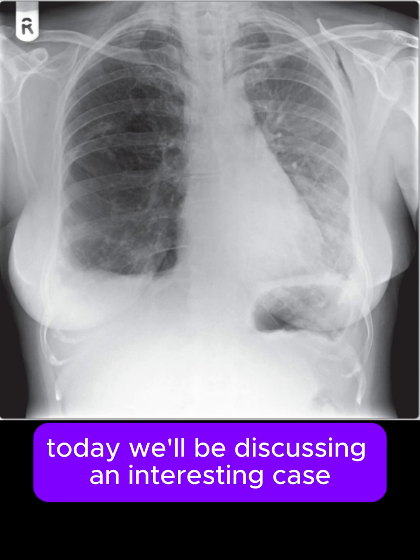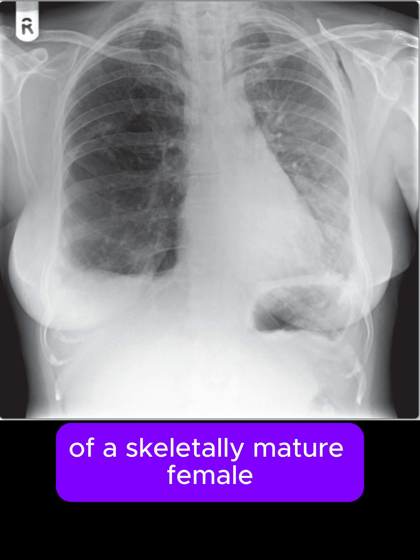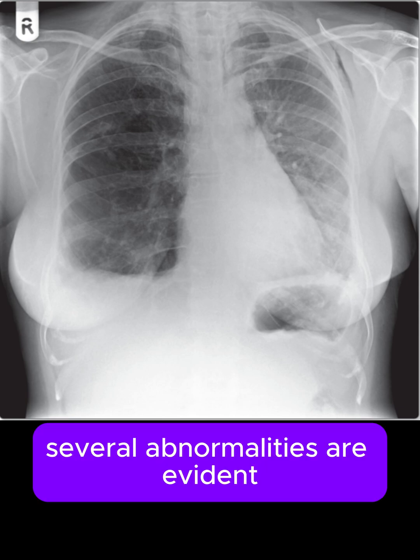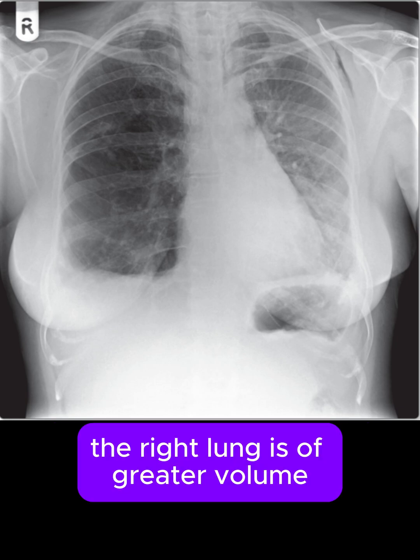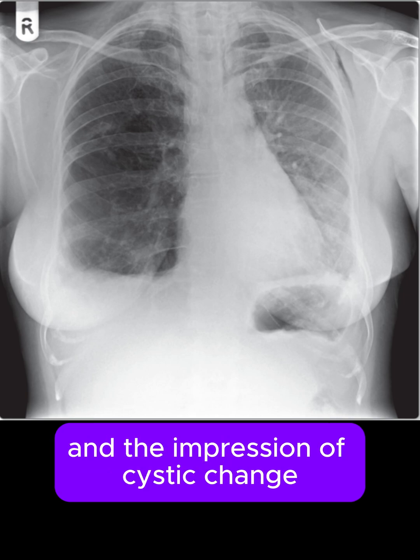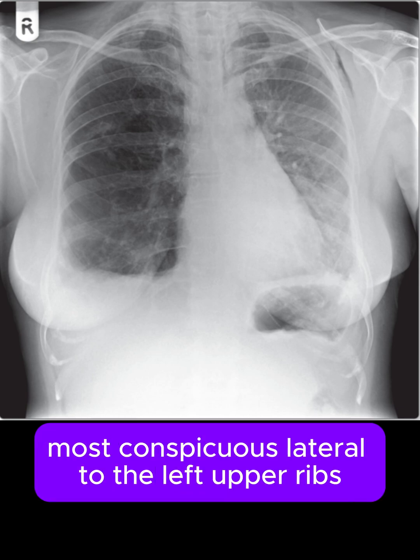Today, we'll be discussing an interesting case involving a frontal chest radiograph of a skeletally mature female. Several abnormalities are evident. Although the radiograph is fairly well centered, the right hemithorax is more lucent than the left. The right lung is of greater volume with coarse interstitial shadowing and the impression of cystic change involving all zones. There is subcutaneous emphysema, most conspicuous lateral to the left upper ribs.